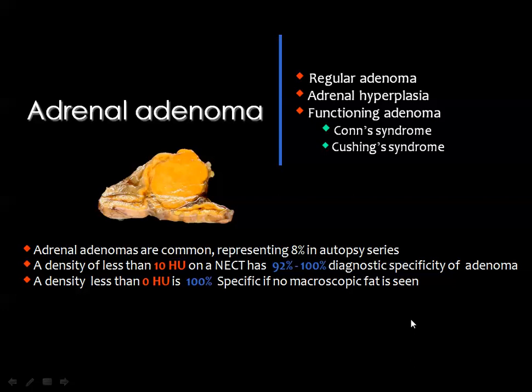The lipid-rich adenoma is usually of low density on the non-contrast CT images, and it will enhance whenever you inject contrast material, then the enhancement will wash out in the delayed scans.